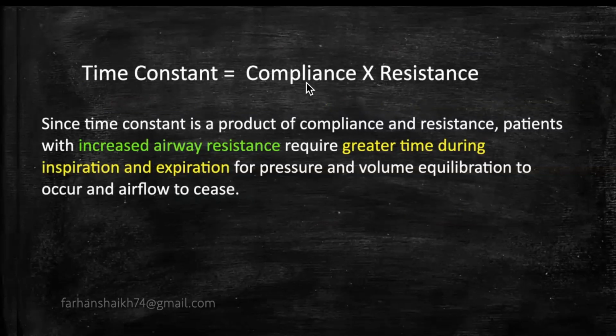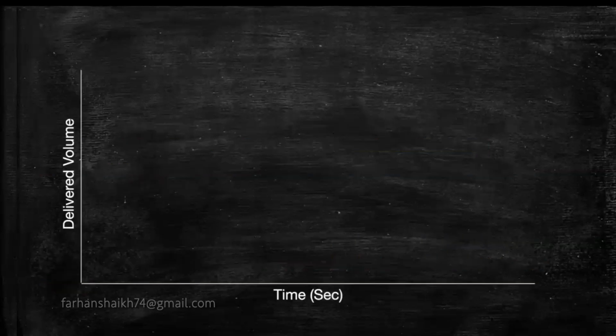But of course, it can happen is a different thing. For oxygenation, you want to maintain a positive pressure over a longer inspiratory time. Some people keep a longer I time for better oxygenation, for better mean airway pressure across the inspiration. That is a different thing. But the airway equilibration or time constant requirement is shorter for patients with poor compliance.